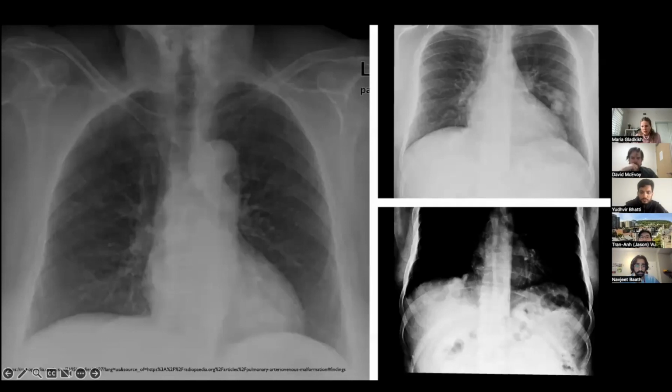And this is just another case of arteriovenous fistulas that I found. This was a retrocardiac density. So again, you're doing your search, you grade whatever, you do everything thoroughly, and then you do your review areas, you look at the apices, and then you're like, oh, what is going on here? That doesn't really look like a regular heart, right?